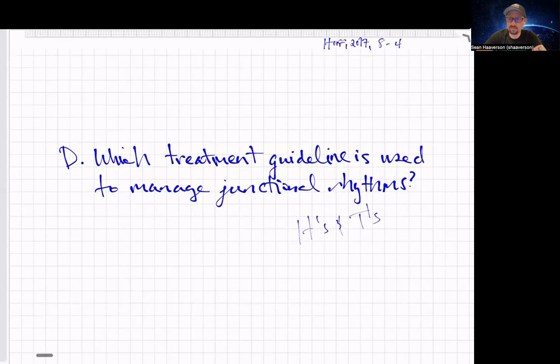So hopefully this is helpful for you. If you have any questions, please reach out to me. And as you're watching this for the paramedic class, these are only a couple of the Huffbook measurements that you'll be making. So do your best to go through, measure the different beats. So if we have a beat that has a different morphology, we have to measure that again. So we can't use that as a representative beat for all the different beats. So we'll have to measure those different beats, QRSs, PR interval, evaluate for changes in T waves and so on.